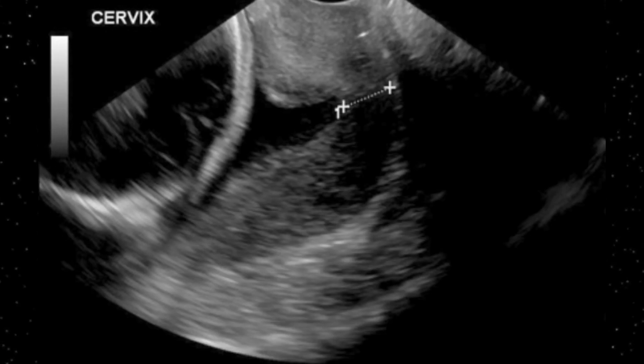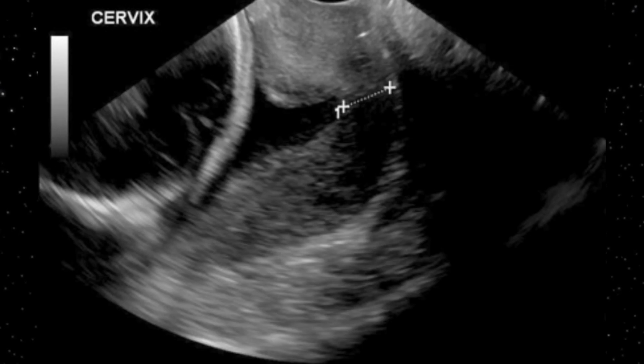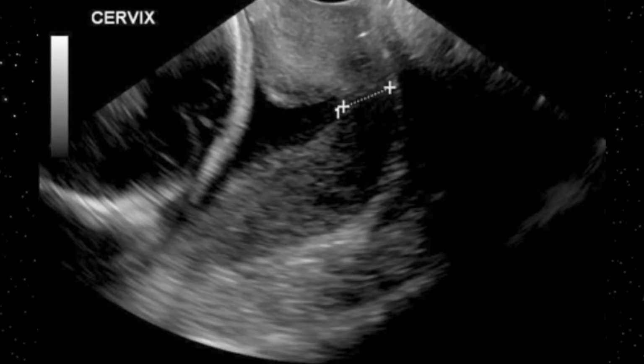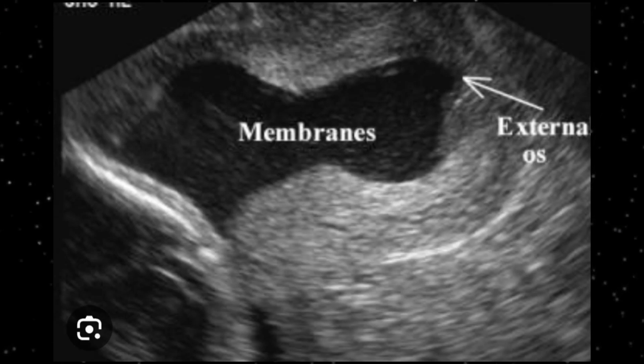So you have to put all this information on your ultrasound report, and with that mark that immediate attention is required to prevent the pregnancy loss due to the severe condition of cervical incompetence. This is a quite extensive case of cervical incompetence.